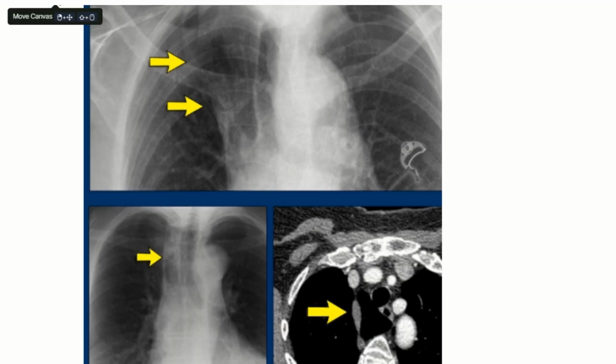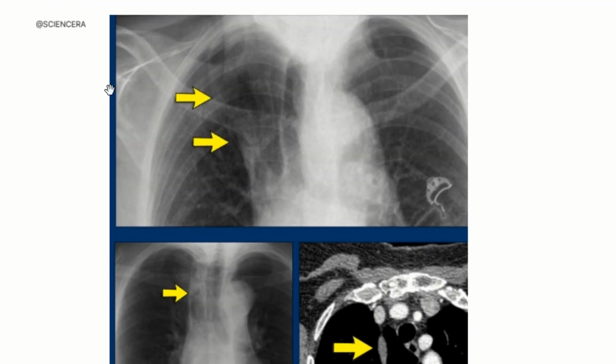Let's zoom in. Okay, yeah. So the top part, azygous lobe. A common normal variant is the azygous lobe, and the azygous lobe is created when a laterally displaced azygous vein makes a deep fissure in the upper right part of the lungs, as indicated in the diagram.